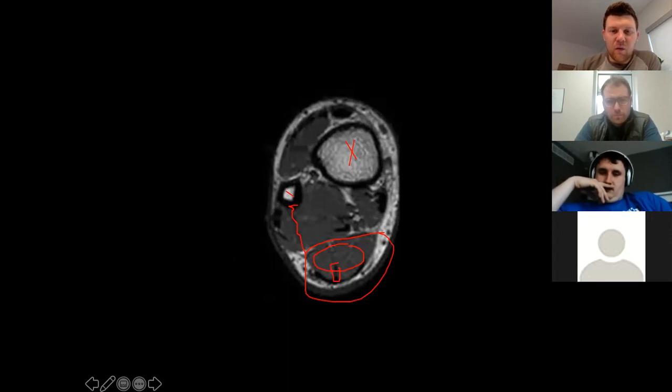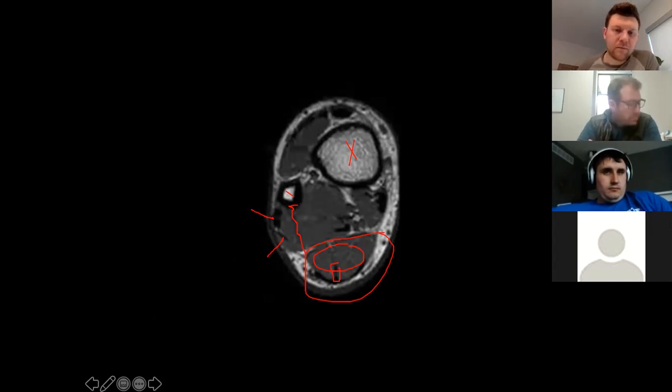Sweet. So clearly in the lateral compartment, I'll start by annotating here. We can see something there, and we can see something there. What do you think you're looking at? So the first line is pointing to the peroneus brevis tendon, that black dark circle. And then more posterior right behind that is the longus, I believe.